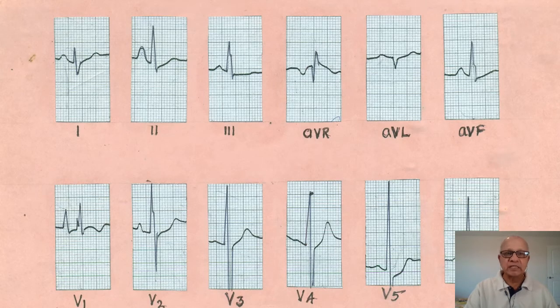Now this is the ECG of an 8-year-old child who was brought for recurrent respiratory infections since childhood. The questions here are: what findings do you see in the ECG? Second, what is the QRS axis in this patient? And the third question is, what do you think is the cause of the child's illness? What caused these ECG changes?